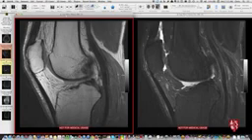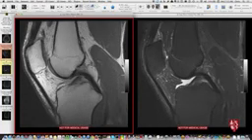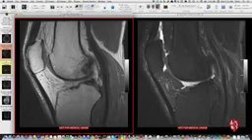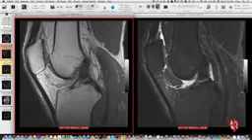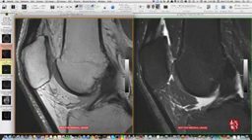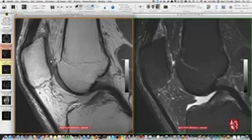And then it's really important to look at the articular cartilage of the patella, and maybe even more importantly, the trochlea. So here, this gray along here, this is the femoral trochlea that articulates with the patellar cartilage. And if I zoom in on that and move it a little bit, the patellar cartilage is a little bit abnormal here. It's got a little bit of heterogeneity in it right here, a little bit of low signal there.